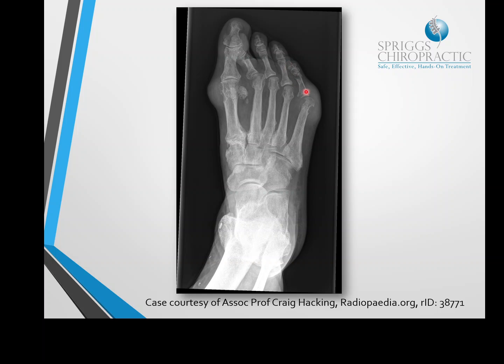You've got clearly subluxation of the little toe, and again lots of soft tissue swelling. We've also got subluxation going on here of the second toe, just here as well. So not a particularly good looking foot just there. This is going to obviously be incredibly painful with all this soft tissue swelling.